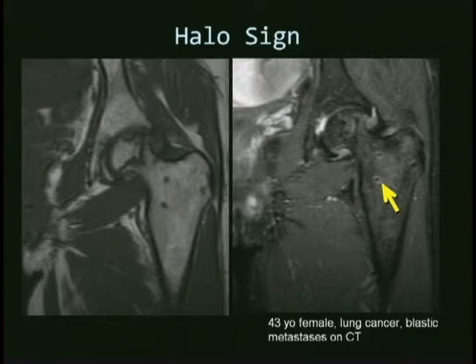So look for that sign on the T2 sequences or following IV injection of contrast. Incidentally, she also had a pretty extensive avascular necrosis in her hip.